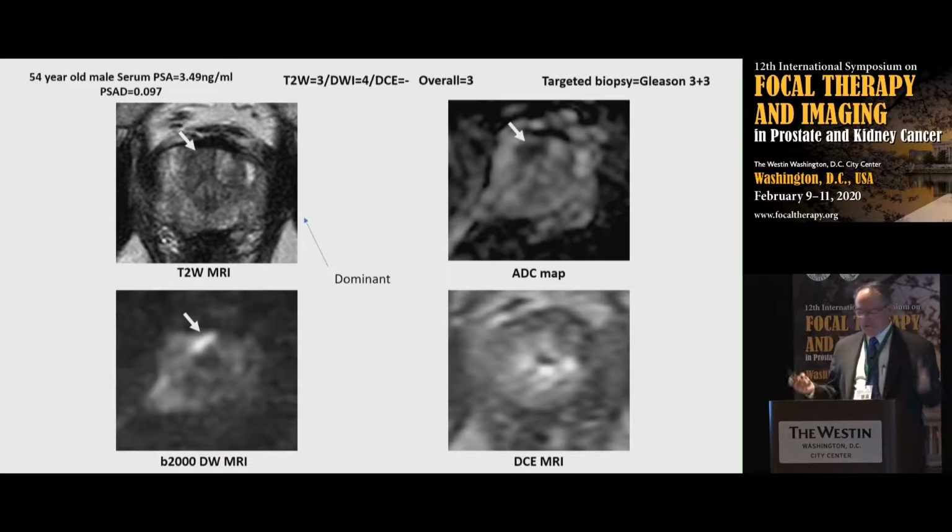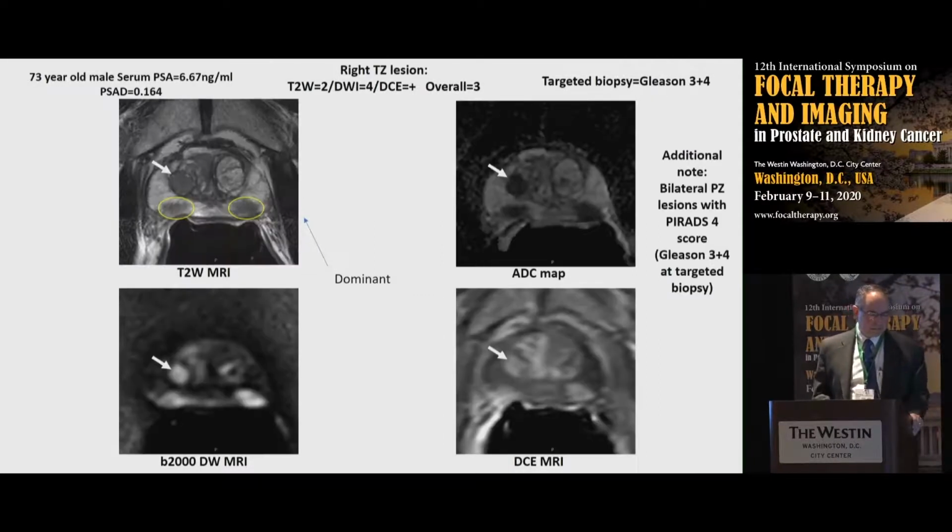So there's confusion about this, showing some high-risk features, but at the end of the day, you have to call it a 3. And it is a cancer, although a low grade cancer.